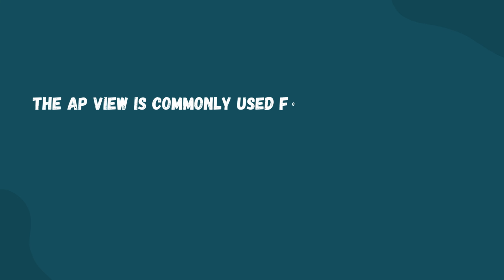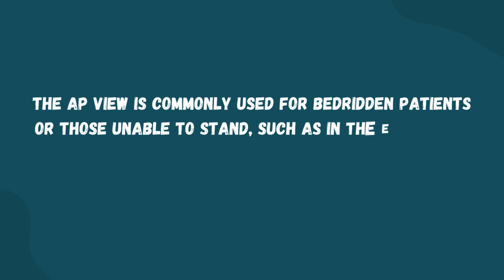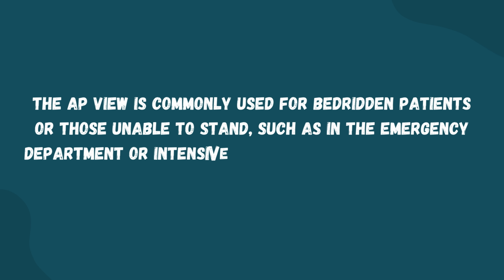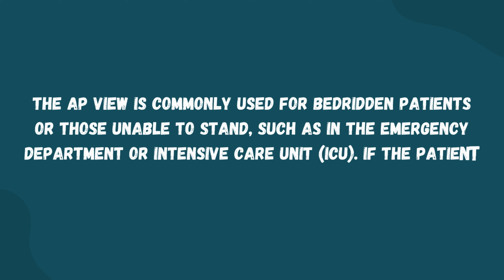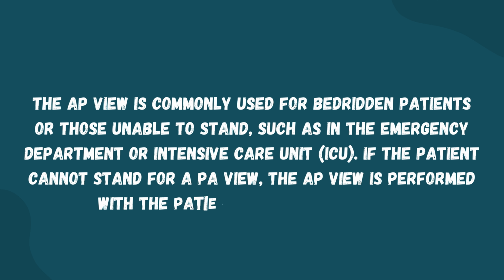Anterior-posterior view. The AP view is commonly used for bedridden patients or those unable to stand, such as in the emergency department or intensive care unit, ICU. If the patient cannot stand for a PA view, the AP view is performed with the patient lying on their back.